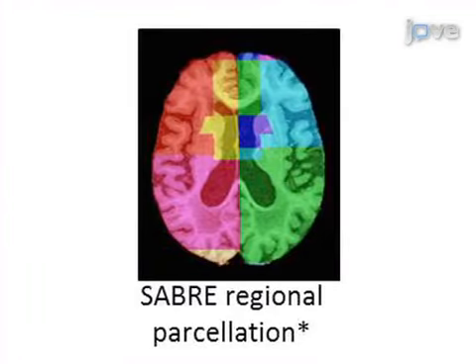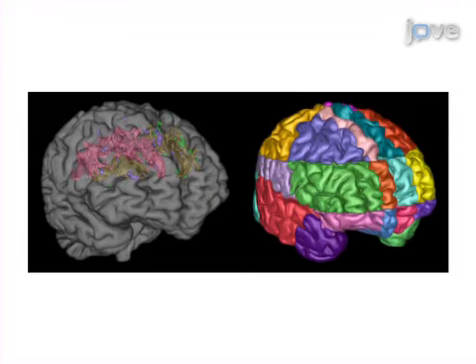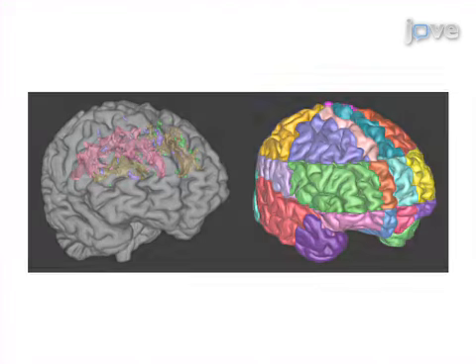Next, anatomical landmarking is performed on each individual to parcellate the brain into 26 standardized regions of interest. Results are obtained that show differential regional neurodegeneration and vasculopathy patterns between disease groups based on brain tissue atrophy measures and lesion volumetrics obtained from structural MRI.